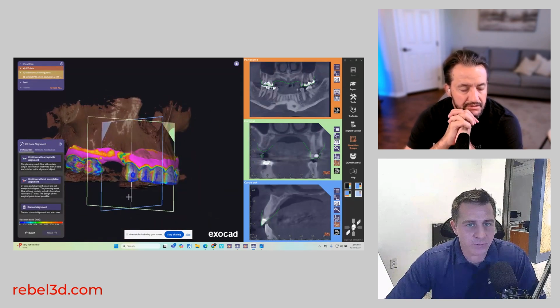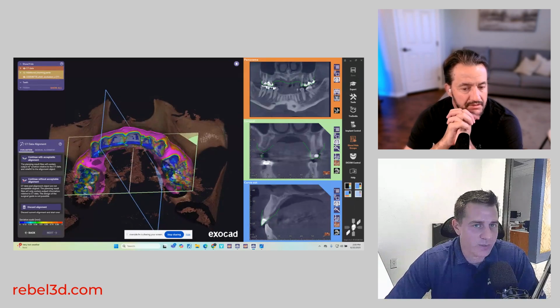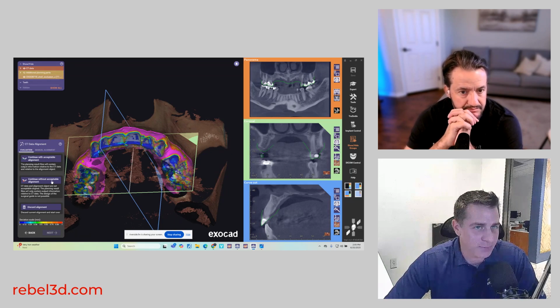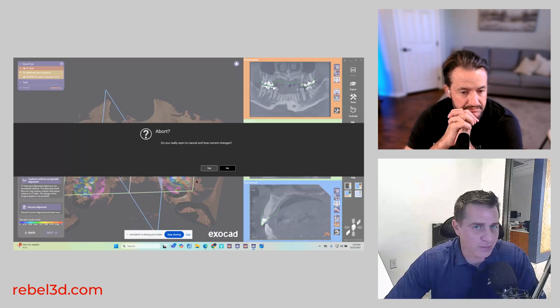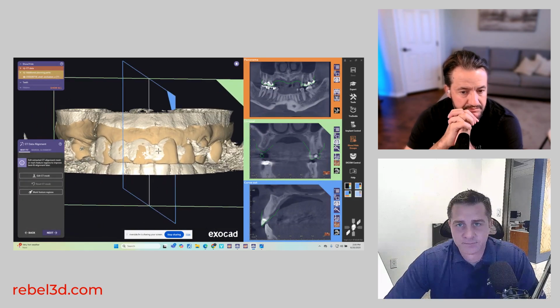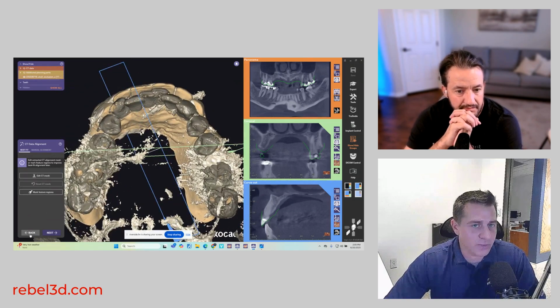You've got some blues in there. Now, if you didn't like it, you can always back out of it and redo it. You can continue with and accept the alignment, or you can continue without accepting the alignment, which I don't see why you'd want to do. Or you can back it up and try to realign it. So if we didn't like that one, let's go back and realign.